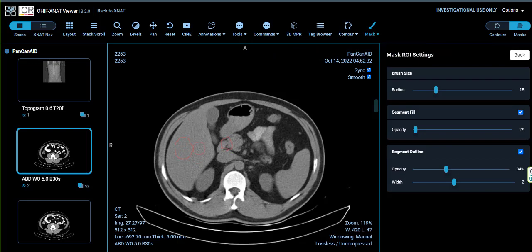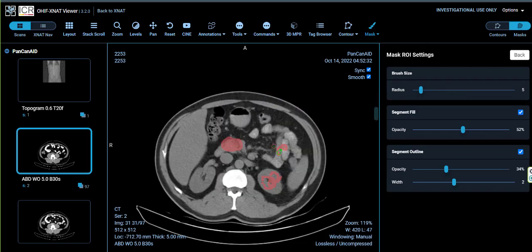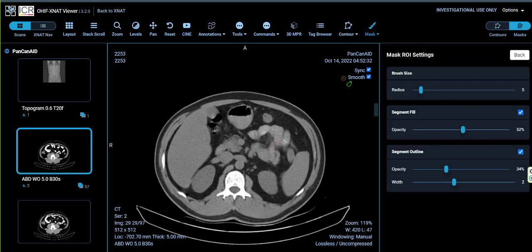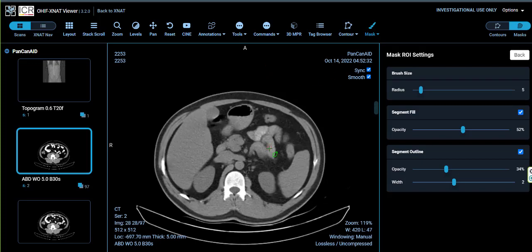As you can see, I am pressing the square bracket open and close, so it will change the size of my brush. This is one of the most important things that you usually want to do. And for scrolling, you just need to use your mouse as a scroller. Let me check for other shortcut keys for you. I couldn't find any more useful shortcut keys for you.